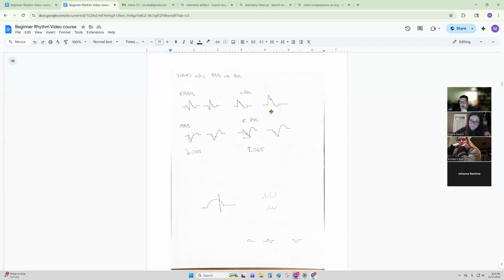Not necessarily, but you are going to see a significant wider QRS complex where between right bundle branch and left PVCs, I feel like it's pretty easy because you're going to have that first negative little dip that's quite pronounced, where left PVCs is solely straight up off the baseline. They're going to be quite wide into a negative T wave. Okay. These two tend to be easier to tell the difference.